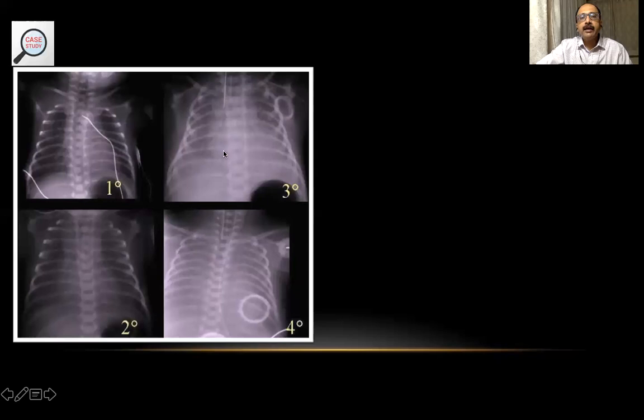Anytime you find grade 3 or grade 4 variety of respiratory distress syndrome, this is taken as moderate to severe form of respiratory distress syndrome, and you would need surfactant and definitely non-invasive or invasive ventilation for these, versus for grade 1 and grade 2 you could get away with non-invasive measures with or without surfactant.